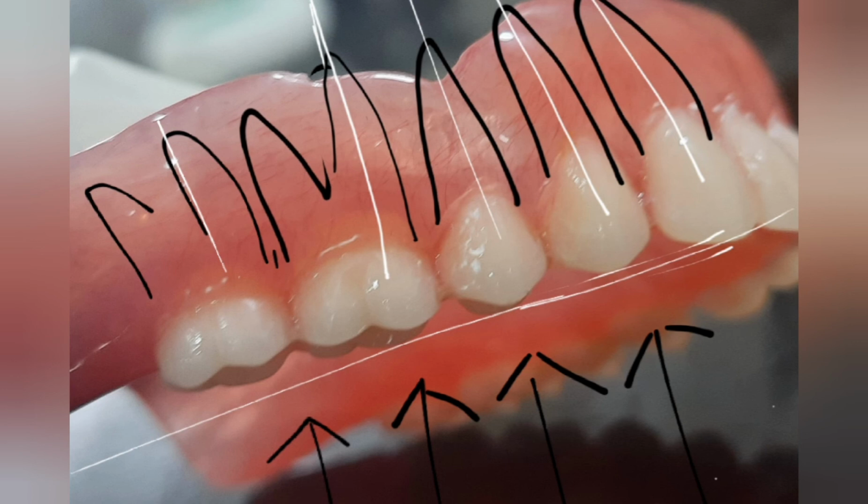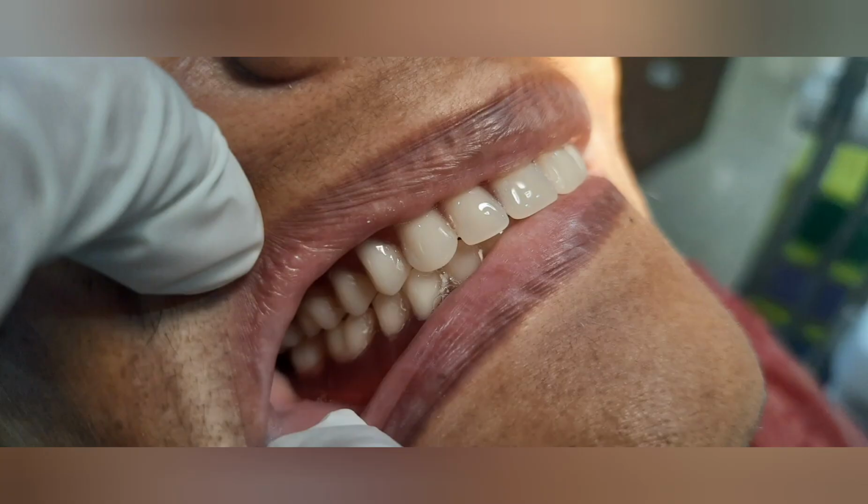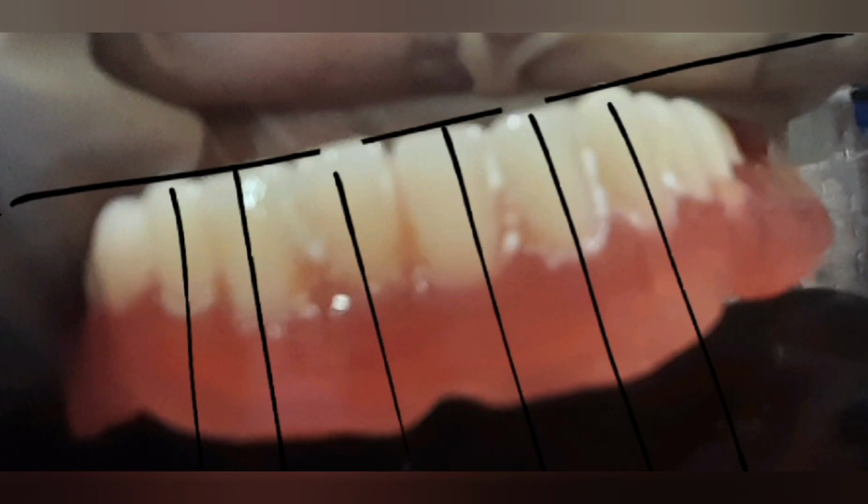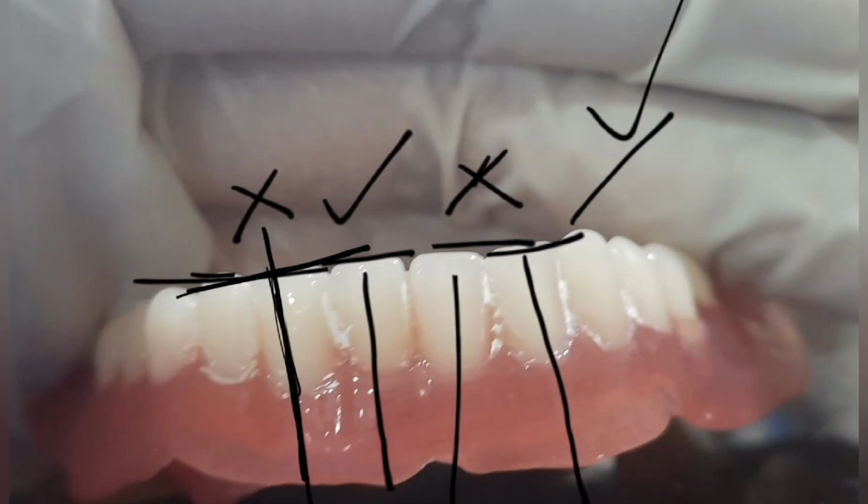Mesiopalatal cusp of the second molar will again rise up to about 0.5 to 1 mm above the distopalatal cusp of the first molar. This gradual rise helps to compensate the natural curves like the curve of Spee and Wilson that will be incorporated for a balanced occlusion in complete dentures. The lower anteriors should lie 1 millimeter above the occlusal plane so that a proper overjet and overbite can be obtained. It should have straight inclination and a proper arch form.